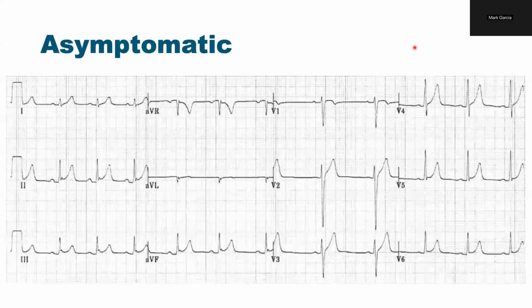let's move on to another ECG. So you can pause this video for a second if you would like, but this is an asymptomatic guy, but what can you see here? Obviously, you should be interpreting these in the clinical context. So immediately, you're probably less worried. It's a young guy, he's asymptomatic. And I've also told you to try to look immediately for a STEMI and look for STEMIs based on the typical regions that you now know about.